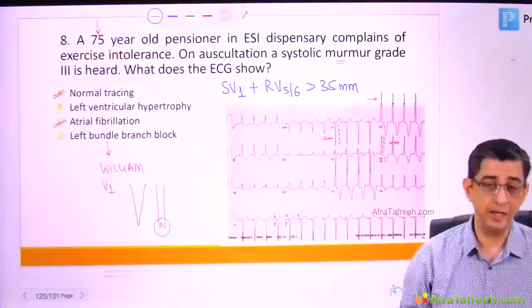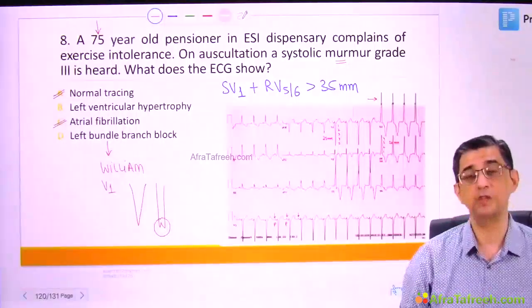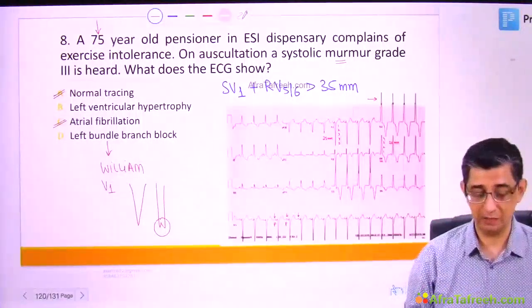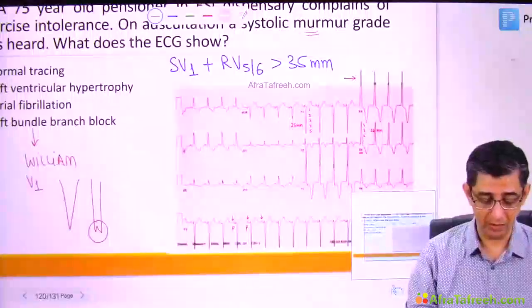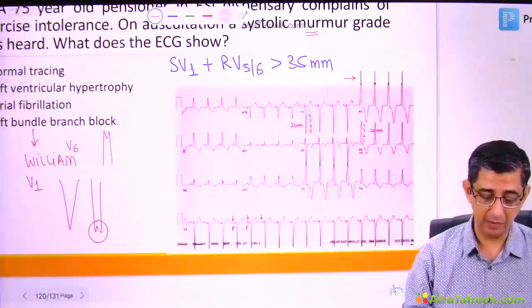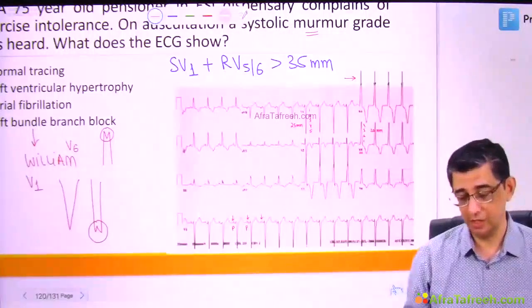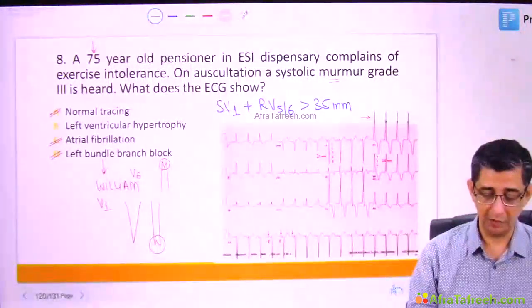This actually highlights the sequential activation of ventricles. You see, in you and me, there is always a simultaneous activation of ventricles, but in these patients, there will be a sequential activation. Because we cannot see any characteristic M pattern in lead V6 (in left bundle branch block there should definitely be a broad dominant R wave with this M pattern, again representing the sequential activation of ventricles and intramyocardial conduction), it is not visible in this case. So by exclusion also, the question can definitely be solved.